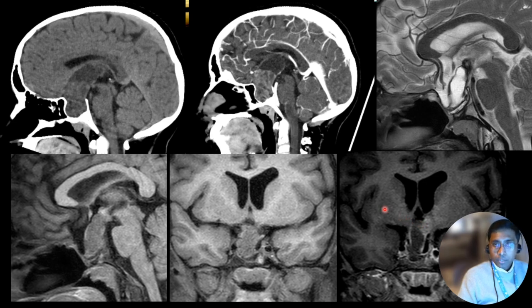Some rarer possibilities would be germ cell tumor. So germ cell tumor typically tends to have much more of enhancement, and we would have a much more amount of solid component in the tumor.